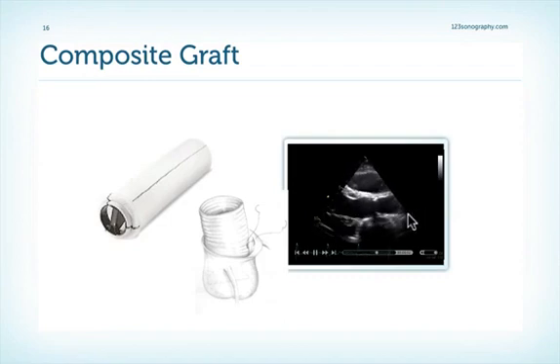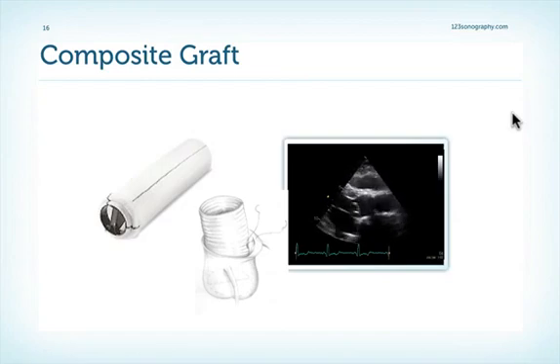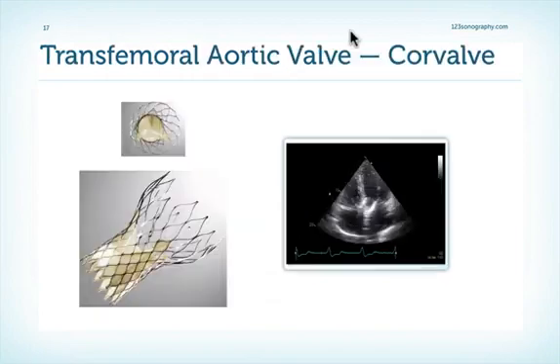of the ascending aorta. The aortic root is usually very thick, and you can kind of appreciate the bright echoes and the zigzag structure here of the wall of the tube graft. Now, this is certainly a beautiful example of such a tube graft. In reality, to tell you the truth, it's very difficult to really see the tube part of the graft. We can easily miss it. Therefore, we have to rely on the correct referral diagnosis and referral information as to what has been operated.